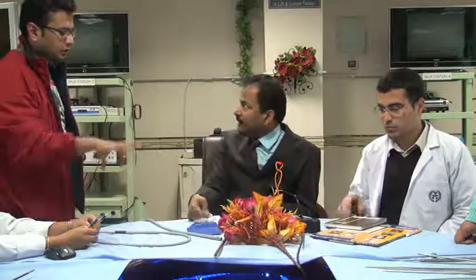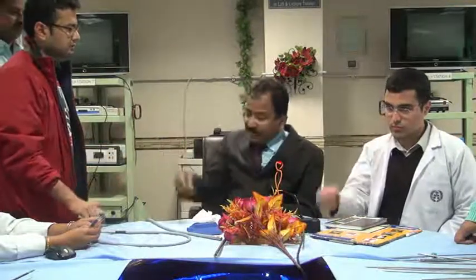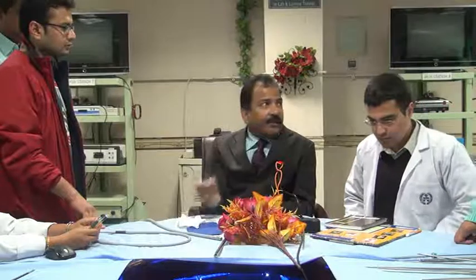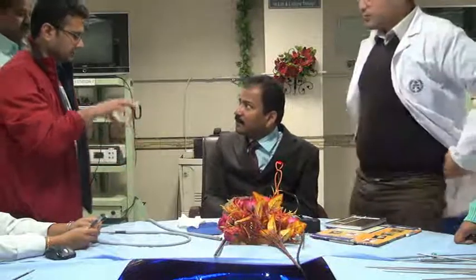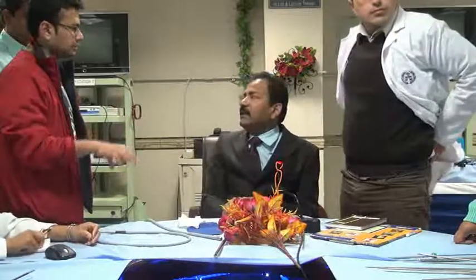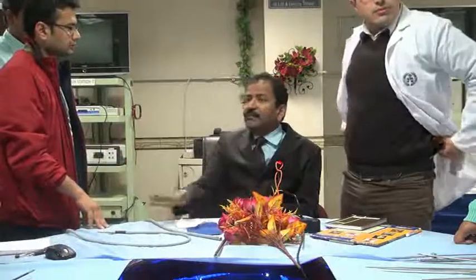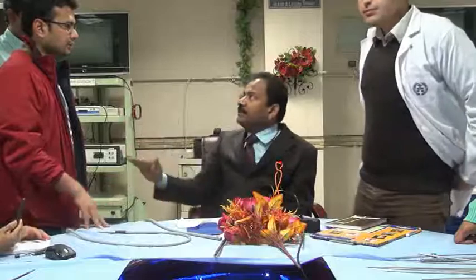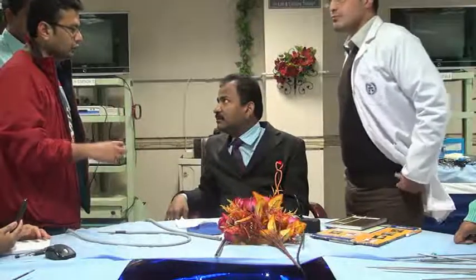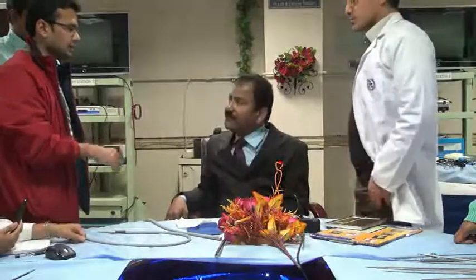But in 3-chip, all the colors will have equal importance. So inside those bleeder points, if the artery lumen is there anywhere, you can catch it. Because white balancing is just showing what the original color is. White balancing will give you that color should be natural. It should not be influenced by the impurity. But in 3-chip, red color won't dominate over the others.